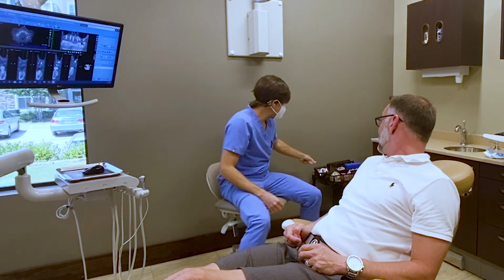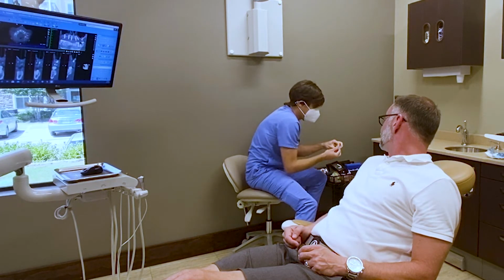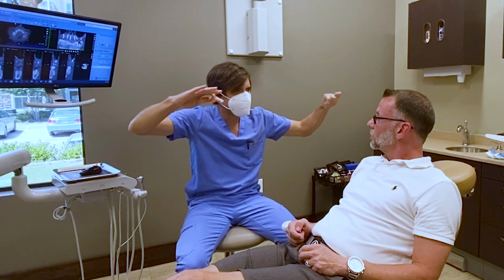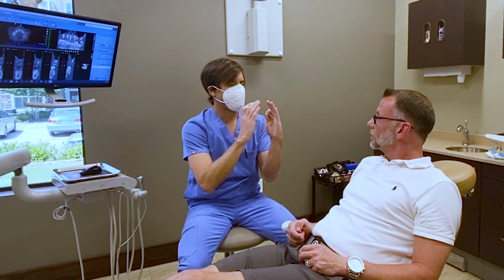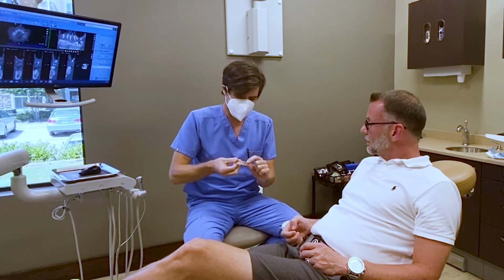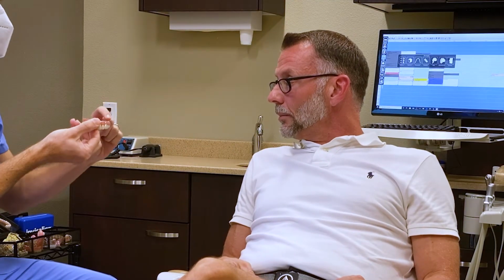So the prosthetics will be, instead of having a male portion going to the implant, you have a female portion going to a very shallow, short abutment. So you have no interference with the connections, nothing. You're working on top of those. So it's like a very conical, I've heard that term. Yeah, this is conical, you see? So this portion, you see, it's easy. You may have differences between the angulations, but you can see this.